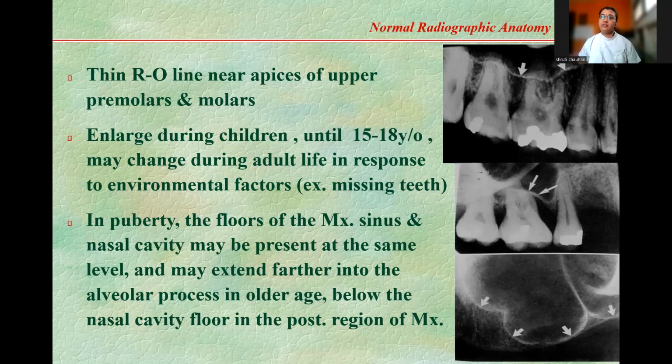Now what are the environmental factors? Like when any tooth is extracted, or any tooth goes missing, or has fallen off, for any other reason, the shape over there is going to change.